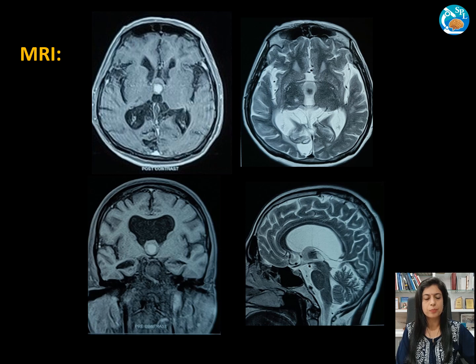lateral ventricle. The T1 weighted images revealed iso-intense signal peripherally and hypo-intense centrally on T2 weighted images. On FLAIR sequences, the lesion showed peripheral hyperintensity and central hypointensity. The central component of the lesion showed signal drop on gradient sequence.